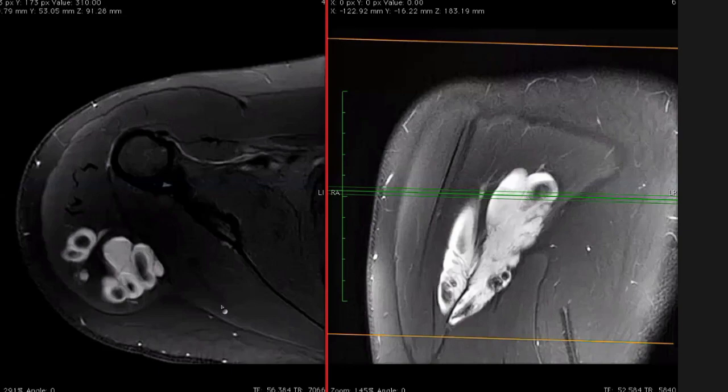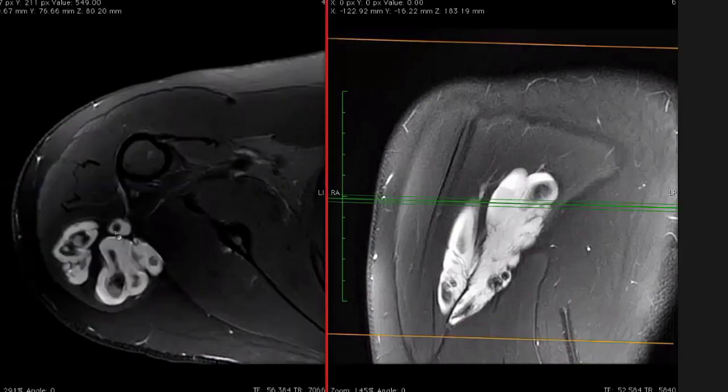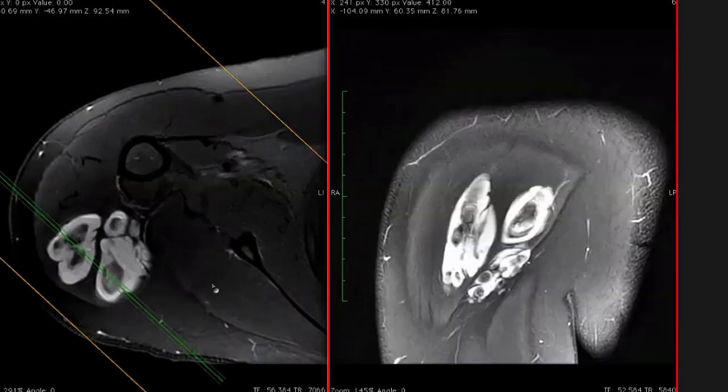All right. So can you think about any lobular lesion that contains fluid, most likely blood, with all these heterogeneous foci inside, including those calcified things, which, if I tell you, are phleboliths? So this is probably a phlebolith. Hemangioma. Okay, one thing that you need to learn today is we don't use the term hemangioma for anything like this in the musculoskeletal system. This is a venous malformation.